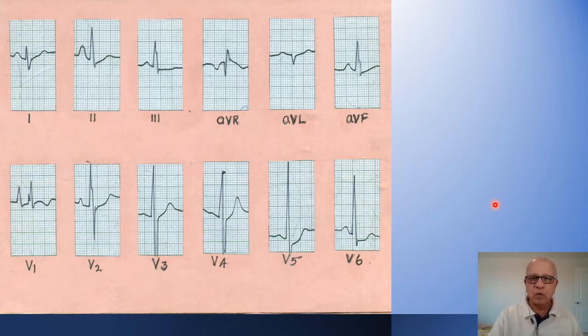Those days, this was an old ECG. Those days we didn't have echocardiography. So cardiac catheterization and other tests were done. And they confirmed the presence of a pulmonary hypertension with a large ventricular septal defect. That was inoperable at that time because the child came very late in the disease.